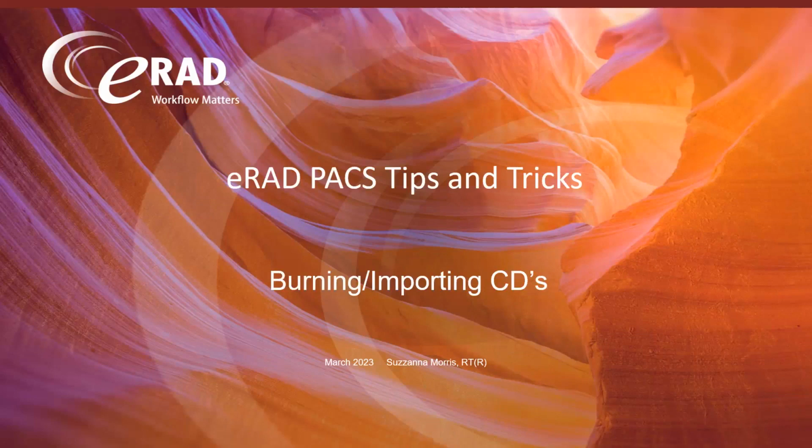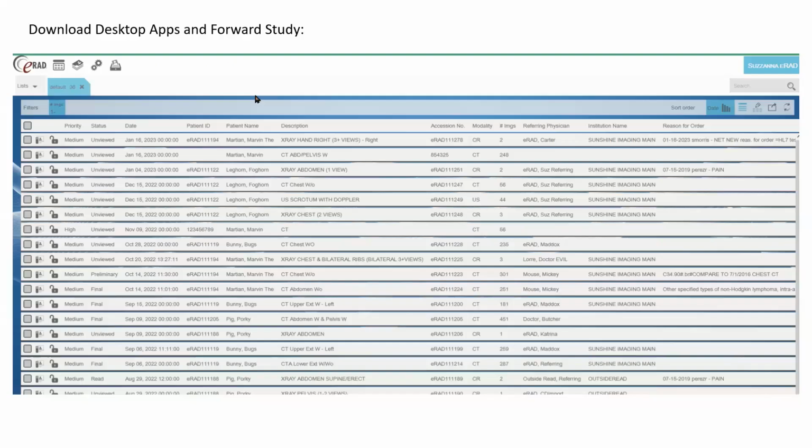Today we're going to go over burning and importing CDs. The first thing you want is to make sure you've got the desktop apps downloaded on the workstation that you are exporting from, and that you also have the permissions to copy and forward studies.